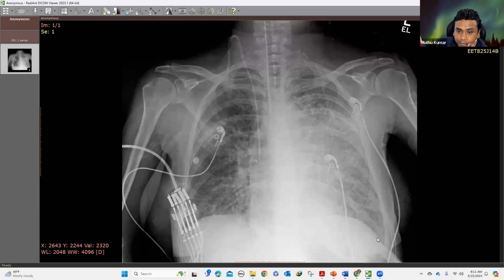There is no evidence of pulmonary edema, and there is no pleural effusion. There is no cardiomegaly. There is no widening of the superior mediastinal silhouette to suggest the patient is volume overloaded. So this patient comes in, I'm just going to give you some history. Patient comes in with a history of weight loss, hemoptysis. What do you think is going on? Heavy smoker.